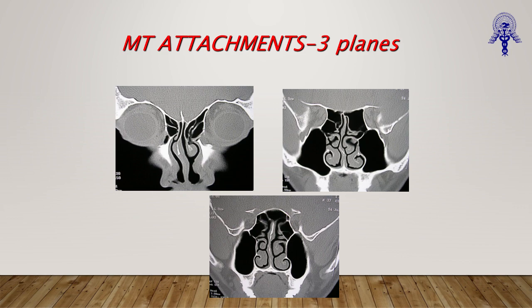You also assess the crista galli, cribriform plate, medial lamella, lateral lamella, roof of the ethmoid, and the lamina papyracea here. Subsequently, you go to this scan where you can see the basal lamella, the transition from anterior to posterior ethmoid, and also the opening here, which is nothing but the natural ostium of the maxillary sinus. I will also show you how to assess the accessory ostium.